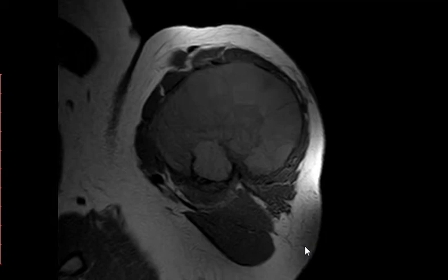So, which is the top differential? This is most likely to be an aneurysmal bone cyst. It has multiple fluid levels. Some of the fluid levels have blood signal intensity. It is arising from the medullary cavity of the bone and extruded to the outside. It has no soft tissue component. It is displacing, not invading, not extending to other structures. It is long standing from the history, which you didn't ask.